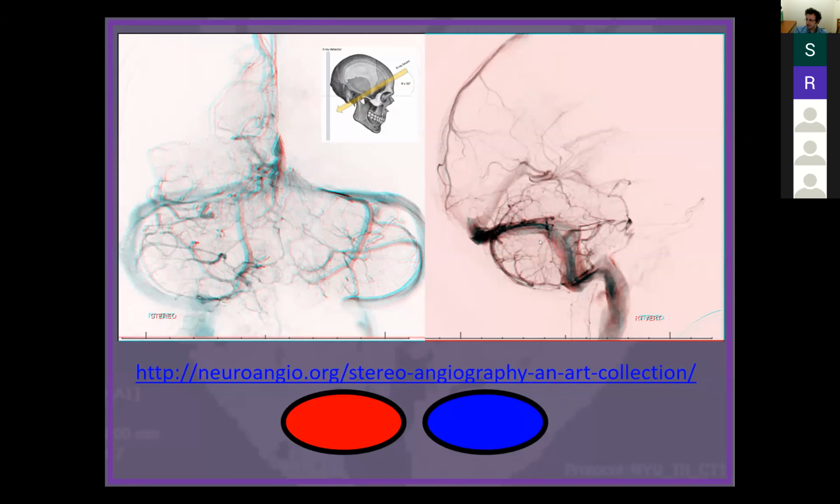And those we'll show a little bit later. They're related to the drainage of the choroid plexus of the fourth ventricle. And they're coming up here. And these are the petrosal veins. So this group is the petrosal, the anterior petrosal group. That's draining in this particular individual into the superior petrosal sinus right here. Of course, they're superimposed here. There are two superior petrosal sinuses here, right and left, draining into the sinuses over here.